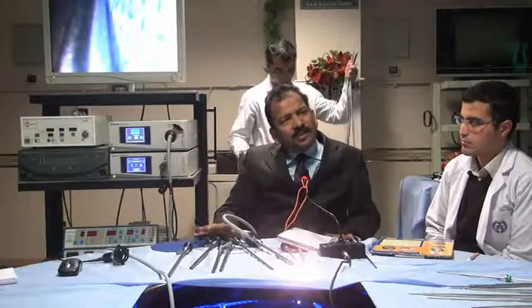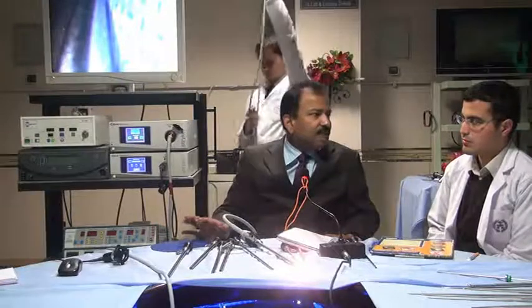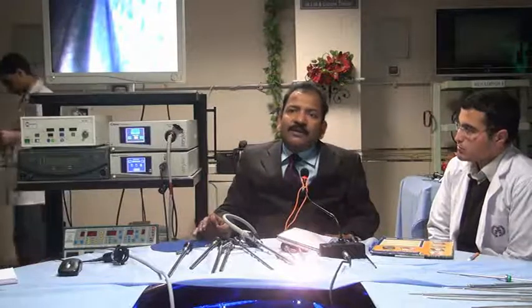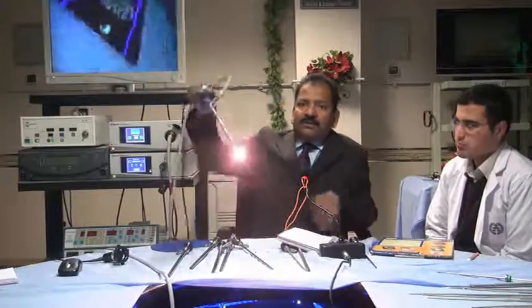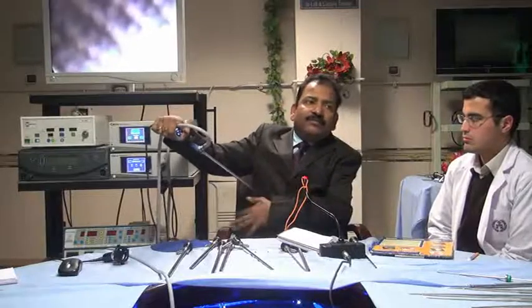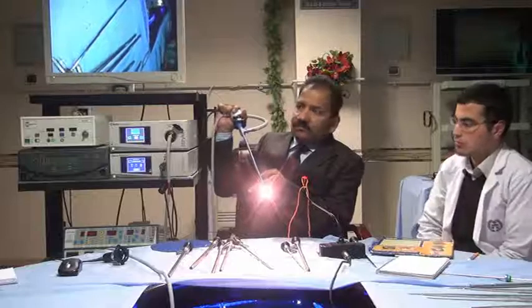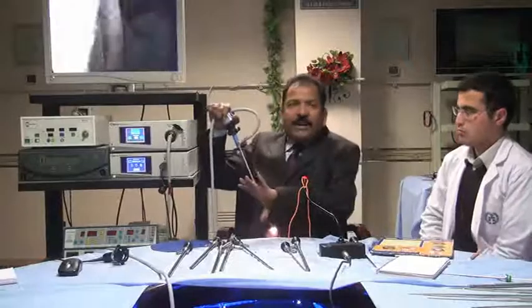Nowadays 0 degree is only used by senior surgeons who are used to it. Because they are familiar, they don't want to switch over. But to start with, 30 degree is better. Maybe some people are using 0 degree in laparoscopy. In thoracoscopy it absolutely cannot be used, because in thoracoscopy you have to go through the intercostal space, like this. And if you have to see the inferior lobe and you do like that, what will happen? Rib fracture. Isn't it? In laparoscopy, even if you pull, the abdominal wall will bend.